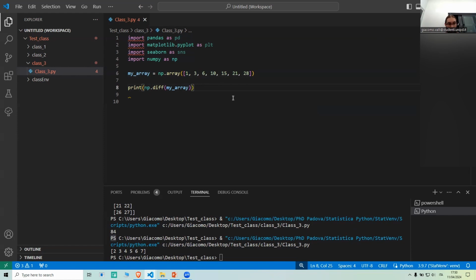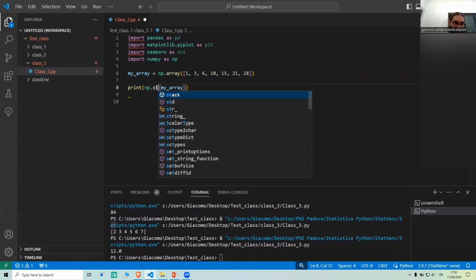If we want to look at electromyography, for example, with this simple function, we already created a differential derivation of our signal. Now we are doing this in a vector, which doesn't make much sense. If we do this in a two-dimensional array and we calculate the difference across rows, for example, we will have a real differential signal. Just to explain to you that these simple functions then have a real application. Once again, we can calculate the mean. We can calculate the standard deviation.